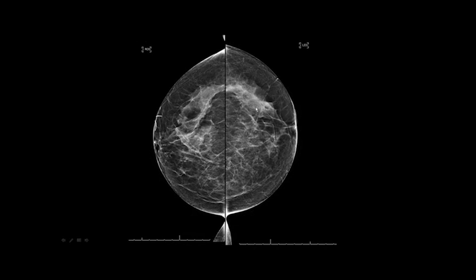What caused this by the technologist? The technologist didn't lean the patient in well, and they didn't pull and hold the breast as they were compressing. You have to pull and hold the breast as you compress without letting go. And you don't let go of the breast till you're done compressing. You just move your hand forward, compress, move your hand forward, compress, move your hand forward, and compress. So that is very important.